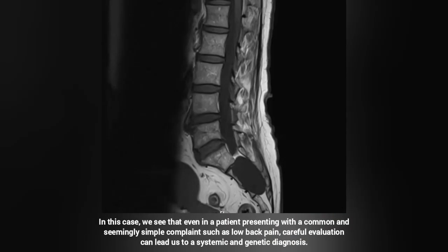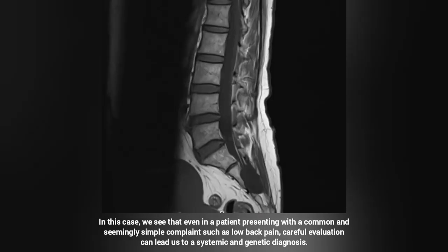This lesion has caused marked posterior scalloping of the sacral vertebrae. In other words, there is a cupping appearance in the bone due to chronic pressure. This suggests a long-standing compressive effect rather than an acute process.